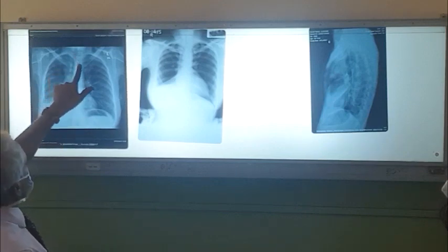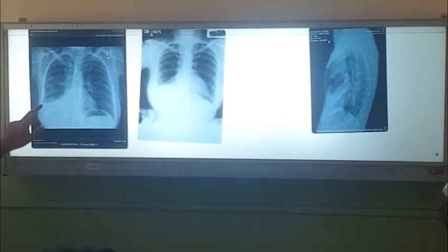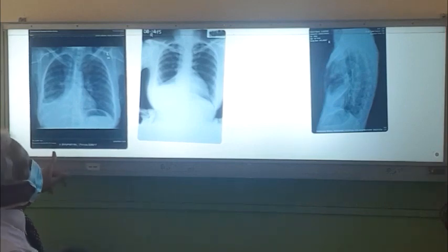So here, the digital film is well centered, but the trachea has gone this way. You can't see the right hemidiaphragm, you can't see the right heart border. And this must be the transverse fissure and a dilated right upper lobe. So this is actually suggestive of collapsed right middle and lower lobes, both. When there is a truncus intermedius lesion, that can happen. So he had a truncus intermedius lesion.